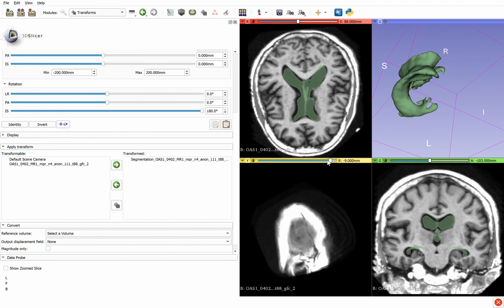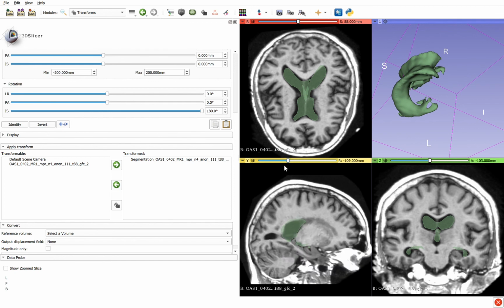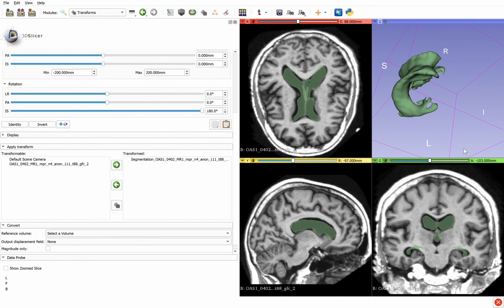You'll notice that the fidelity isn't perfect. The reason for this, of course, is that it has transformed it into this beautiful surface file, but in doing that, it loses some information. We also probably made some little cuts that weren't perfect, but that's fine. I've showed the data to Z Imaging; they seem happy with it. Okay, so go do that.